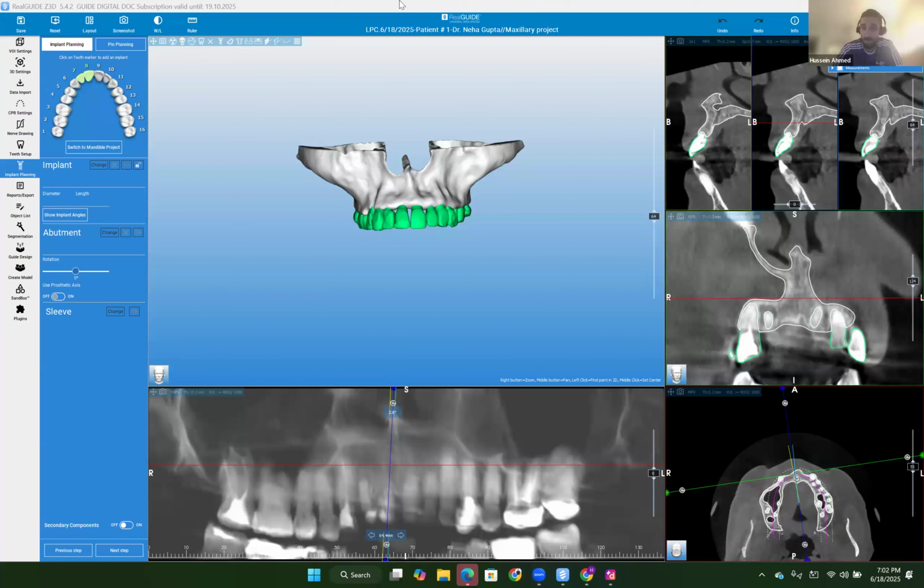Right away, sir. So that's the first site, the site of number 7. I'm going to switch on the segmentation for a second. So here you go, Dr. Resnik. We've got a periapical pathology related to the site of number 7. The labial concavity is a little bit accentuated. As we scroll forward towards the site of number 8, sir, we're noticing over here a resorbed root and an accentuated nasopalatine canal. Can you pull up a bigger view of number 8 there, Hussein? Absolutely, sir. Here you go.